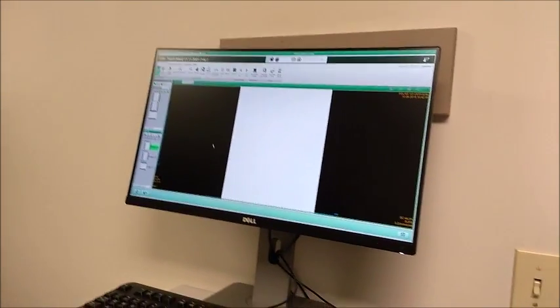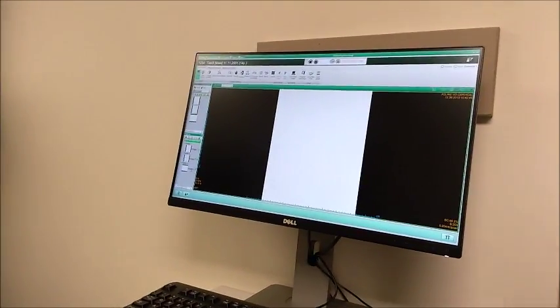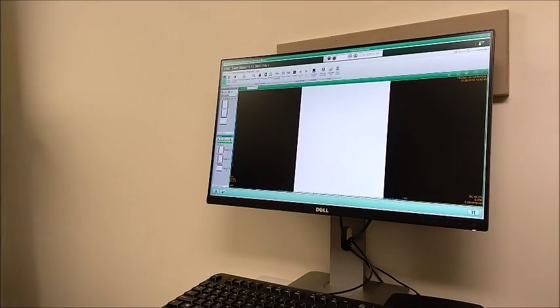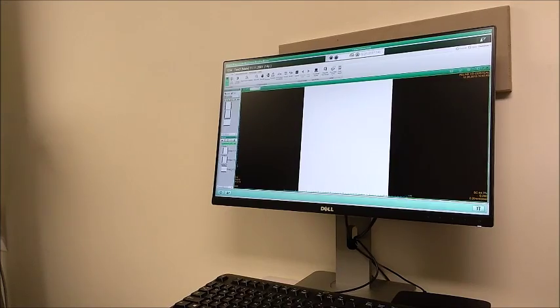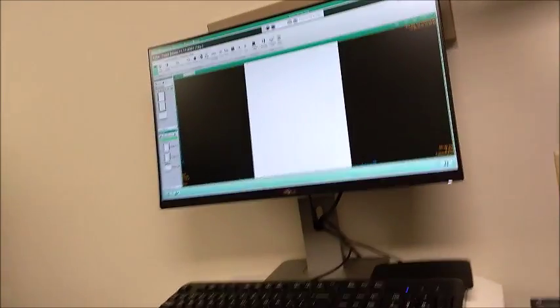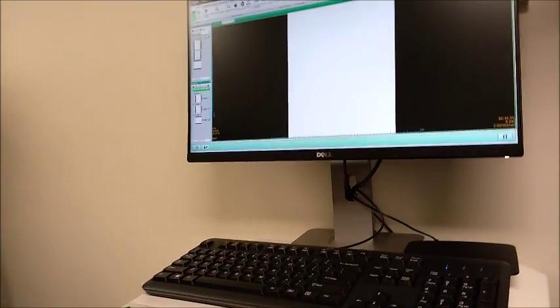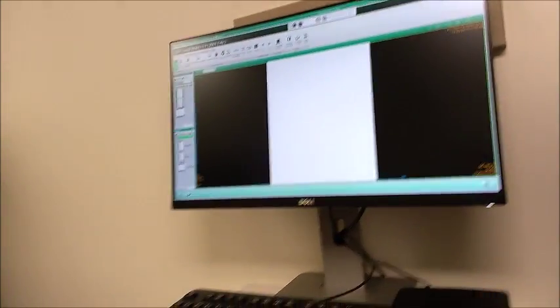What, do you just highlight the top one you said? Yeah, we do just that. Highlight the header. And ideally, we should do that when we're looking at it, when you do the study. That comes up in the viewer. The timing is, I guess, the technician should probably look in the viewer, and then you're going to tell the doctor the x-ray's ready. Right. But when you're finished with the x-ray, you could go look in the viewer and transfer it over there.